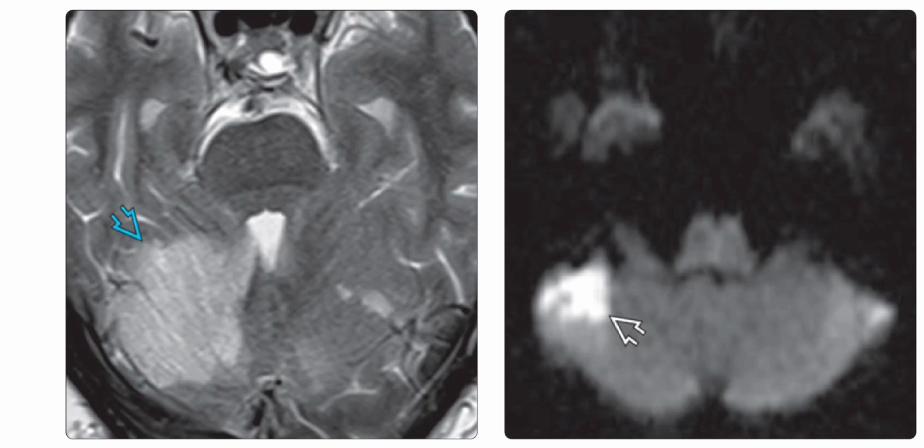Right is the axial DWI MRI image and it shows the acute diffusion restriction in the anterior inferior cerebellum laterally in an AICA distribution. AICA primarily supplies the ventral pons and petrosal surface of the cerebellar hemispheres, the brachium pontis, the flocculus, and the inner ear, as well as cranial nerve 7 and cranial nerve 8.